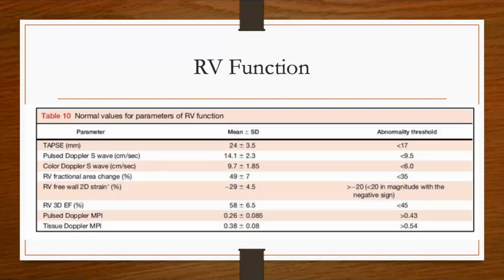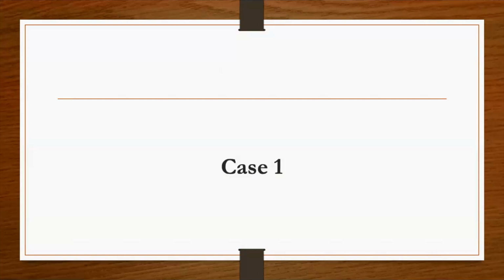So next, I thought I would highlight some cases from St. Michael's Hospital that involve right ventricular pathology, just to make this a little bit more interesting. I have 4 cases. I will go through them one by one.